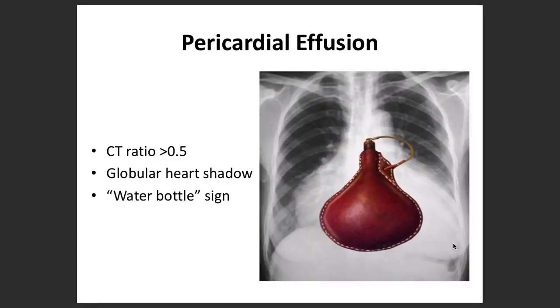So one of the other important things we are always concerned about is whether there is any pericardial effusion. In pericardial effusion, it is called the water bottle sign. In the water bottle sign, there will be a more globular heart shadow. So everywhere, classical water bottle sign.